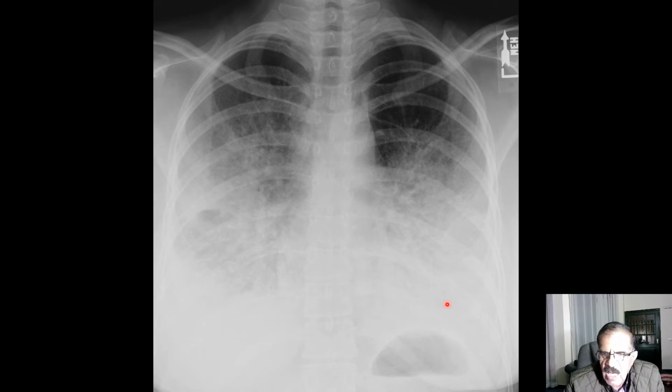I believe there are bilateral pleural effusions also. This can happen whenever there is pneumonia. There may be some pleural effusion also. I believe a little bit of effusion is always there, but on X-ray, in some cases, you can see fairly big effusions also. We call it parapneumonic effusions.